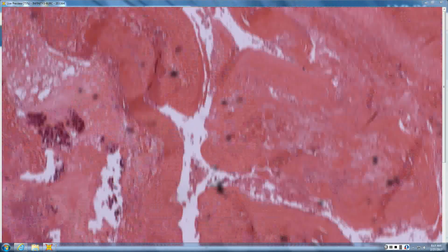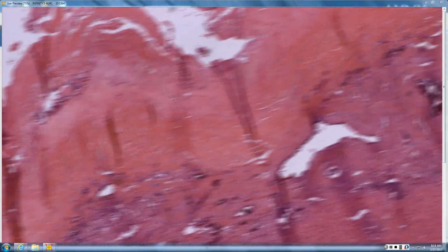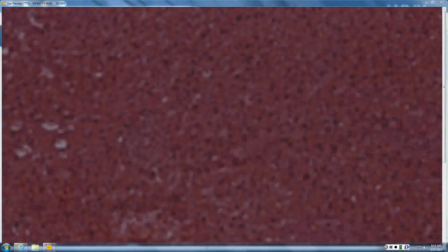So I'm not seeing clear-cut epidermis, and that's partly because we are not in skin. It was a little unfair in this conference.